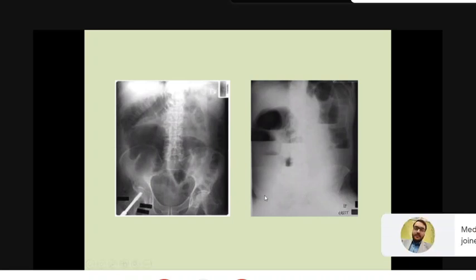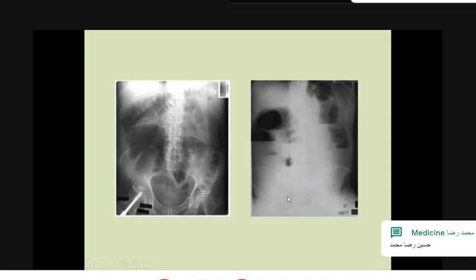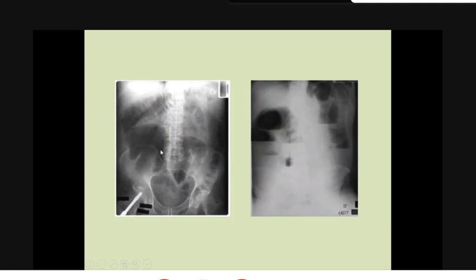So in this form you can see this is type 1 large intestinal obstruction because of absence of the dilated small bowel loops, presence of dilated large bowel loops. This is usually a distended thin wall cecum with the presence of dilated bowel loops peripheral in distribution.